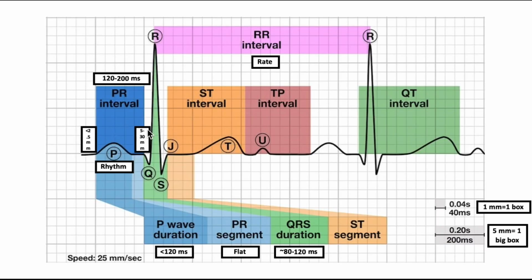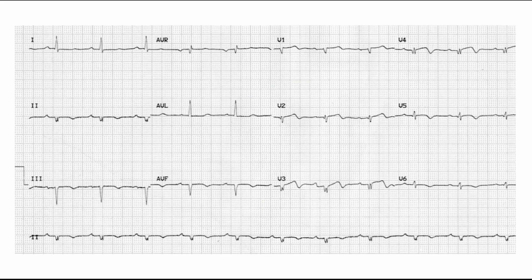So we go over here to the QRS complex. It should be about 5 to 30 millimeters high. Let me tell you that when you know, you know. So for example, we'll look at some low voltage. You can tell without even knowing what type of measurements you need that these are really short, if not inverted QRS complexes. These are a problem. That's very low voltage. Even in these leads, V1 through 6, you're seeing short QRS complexes.